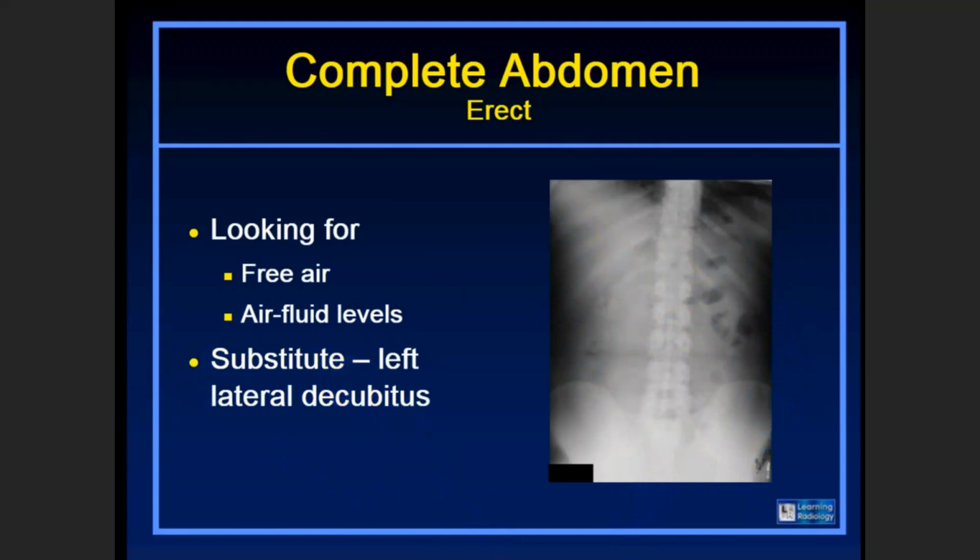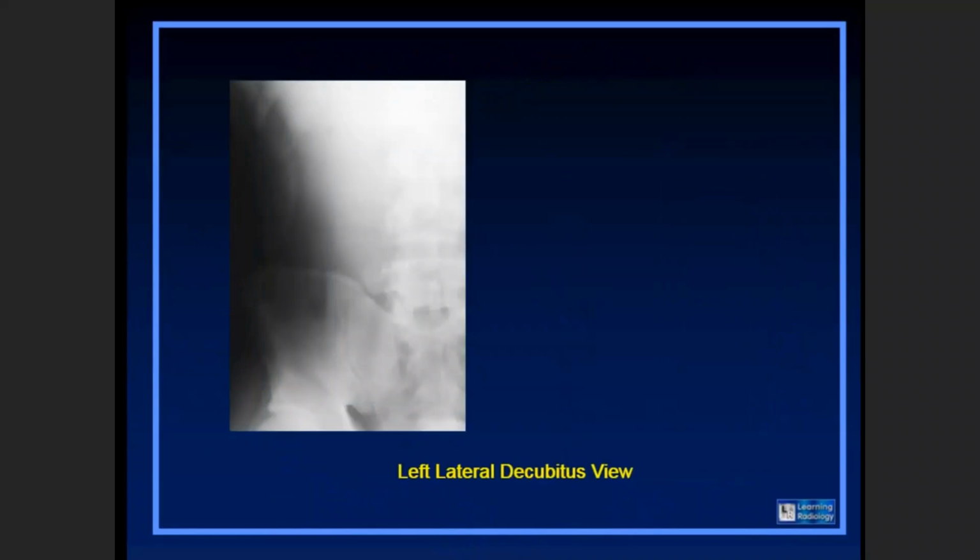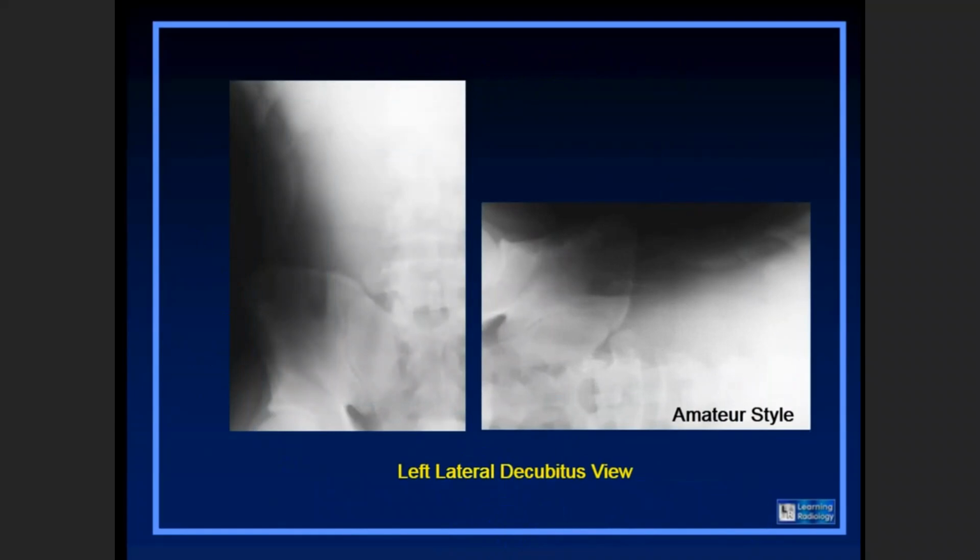Then the left lateral decubitus film. In left lateral decubitus view, if you notice here, we have an air fluid level.